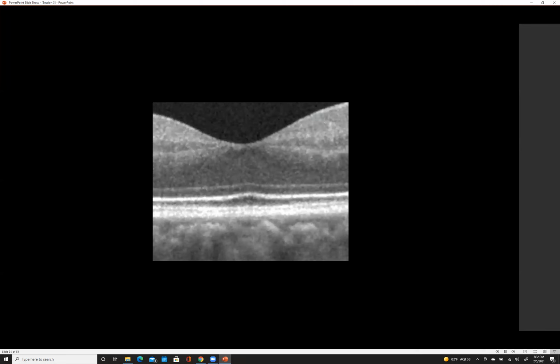You got it. How about that layer? So that first dark line is the myoid layer. And what is that made of? It's a mix of organelles, so the ribosomes, endoplasmic reticulum. Yeah, perfect.